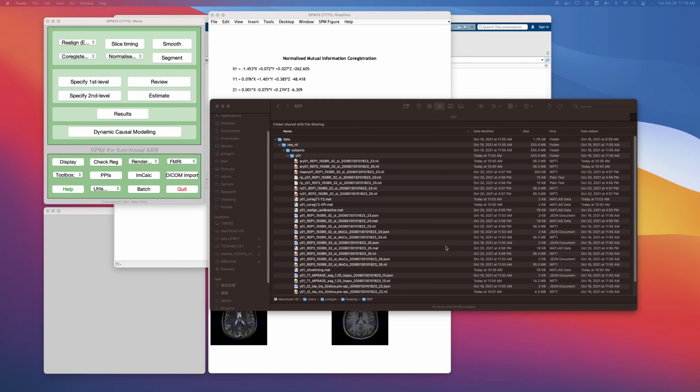We talked about this in detail in class, so I'm not going to go through that again, but this is where we are moving on to in this tutorial. And the first step we're going to do here is we're going to apply segmentation. That's this button here. A little note about what this does, and also contrasting this to another similar algorithm here.